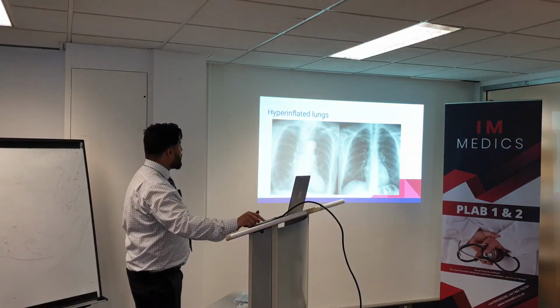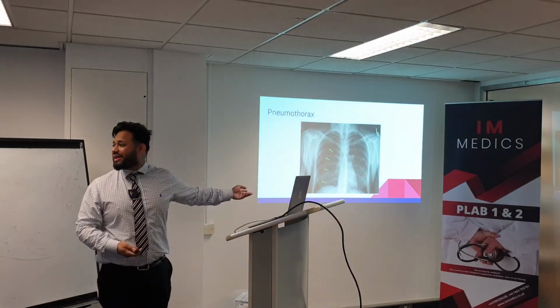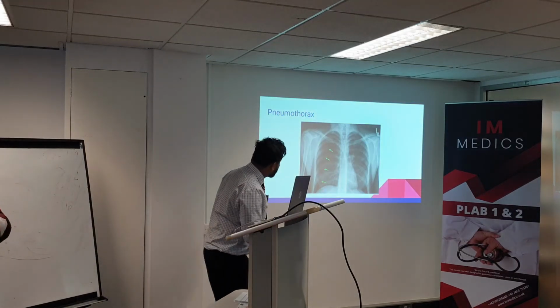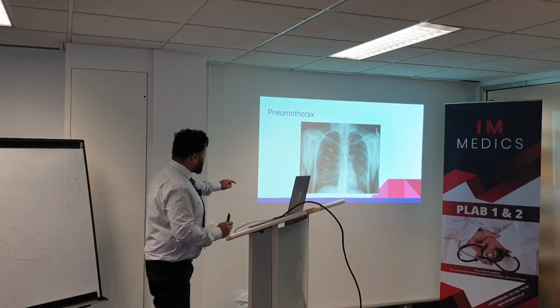Now this one, pneumothorax, you can't see it. I don't know how you guys said this is pneumothorax. I can't even see anything. Yeah, it's a very fine line. Oh, mashallah, you can see the fine line. Okay, you can see it here. Yeah, simple pneumothorax. So it's a very simple pneumothorax.